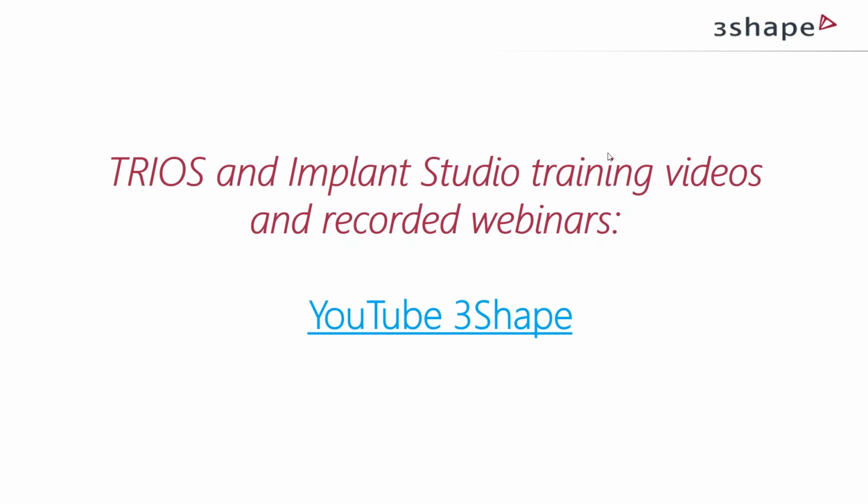If you're new to 3Shape, Implant Studio is an open system. So again, there you have possibilities of integrating it in many different ways into your business.